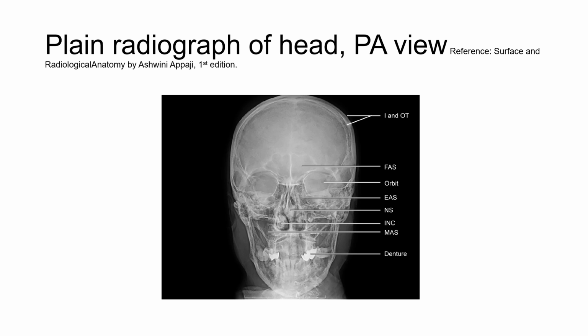Here you see the dark areas. The air filled cavities will be the oral cavity and nasal cavity, and there is some air filled cavity here, the external auditory canal, which you can see a little bit here. Other things are the paranasal air sinuses and the mastoid air cells behind the ear. Sometimes in the neck region you will see the pharynx, laryngeal cavity and trachea.